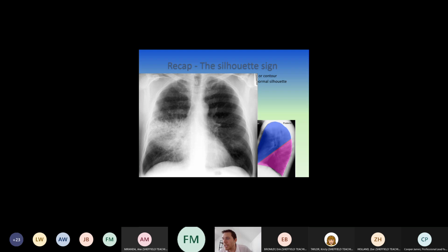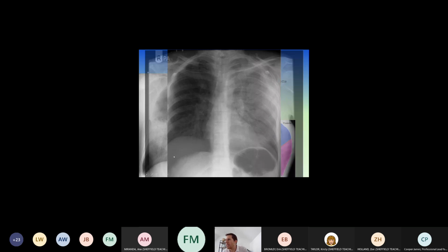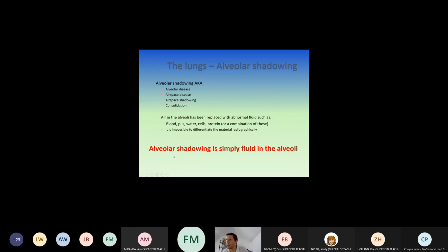If you tell me that this patient is in their 80s, has smoked all their lives, they've had hemoptysis for 6 months, they've had weight loss, they've got a load more red flags, then I would tell you that that's potentially an alveolar cell carcinoma, and it's malignant cells within the alveoli. So there's lots and lots of different causes of consolidation, and they all often look very, very similar. What we're heavily reliant on is a good clinical history, so that I can tell you on the report what I think that is. Often we can't be specific, but sometimes we can.